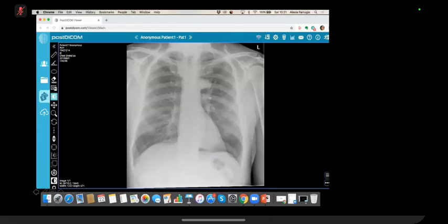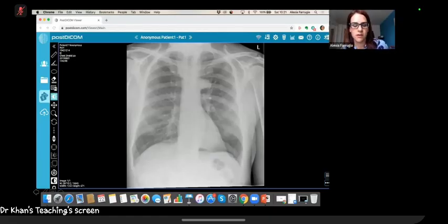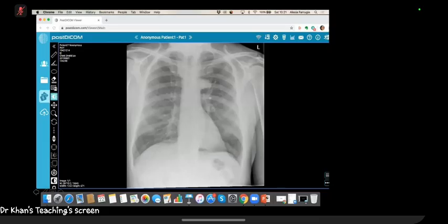Yes, I can. Okay, so just tell me what you see. So, a frontal chest radiograph of an adult patient. In the left upper zone region, there's a well-defined mass abutting the mediastinum. I can't seem to differentiate it from the descending aortic arch. I can't see any bony involvement. There's no pleural effusions. I can't see any surgical clips in the lungs.